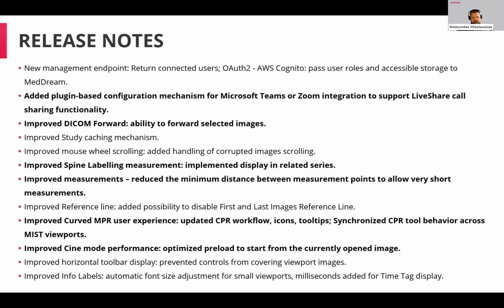Reference line: in the previous version 8.8.0, we implemented showing the beginning and the ending of the reference line, but we got some requests asking whether it is possible to turn it off. So from this version, we improved it, and it's possible to disable showing the first and last image reference line.